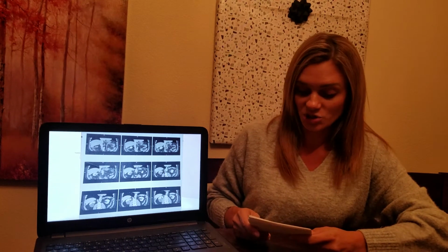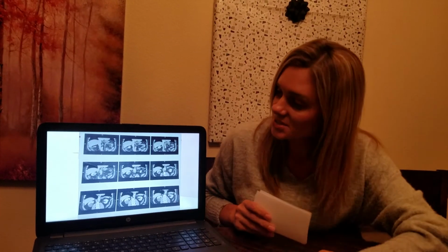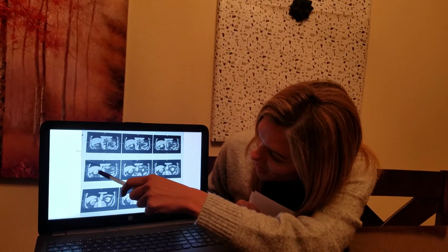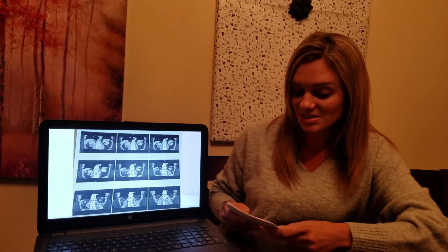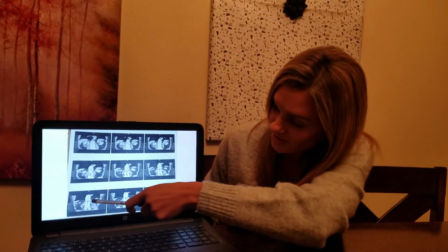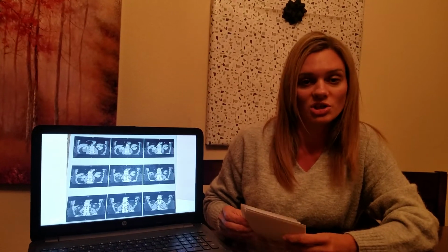This is the first portion. They are coronal slices cutting the anatomy from the anterior to the posterior portions. This would be more of the anterior. As you can see here, the kidney is here, and these are the cysts. As we go down and continue on to the next slide, we get more posterior. And as you can see, the kidney looks bigger and the cysts are more noticeable, as in here and here. The reason for this is because the kidneys are located in the posterior portion of the abdomen.